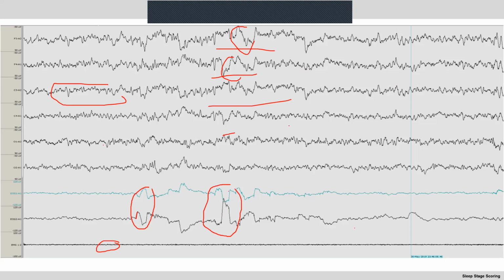Initially, EEG activity was picked up by the EOG, and that was EEG artifact in EOG. Now these eye movement potentials are so big during REM sleep that they are present in the EEG. So this is EOG artifact in EEG in REM sleep. Rapid eye movement is there, low EMG is there, low amplitude.